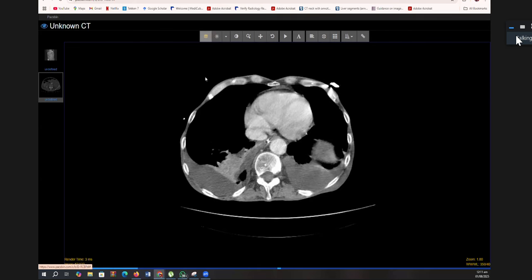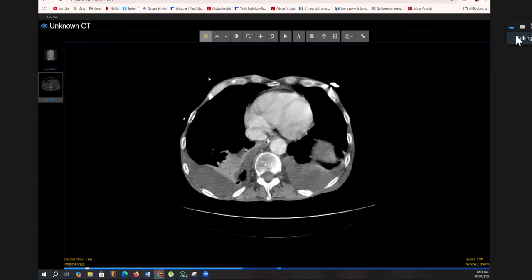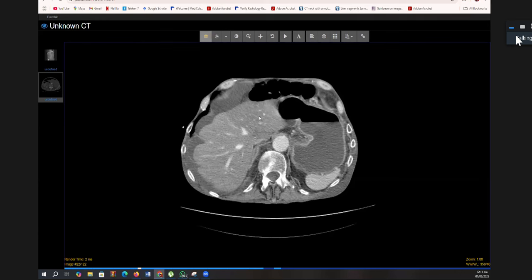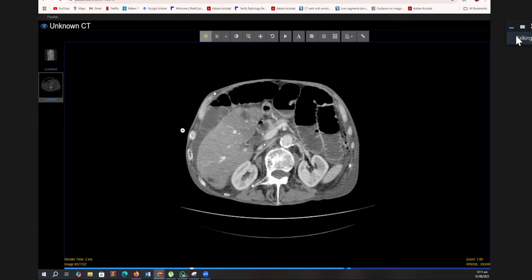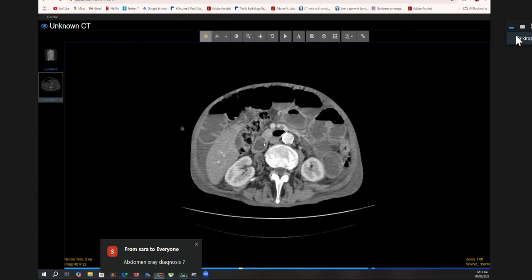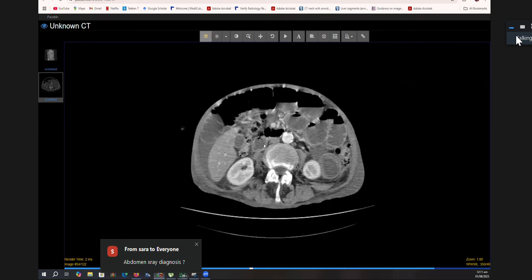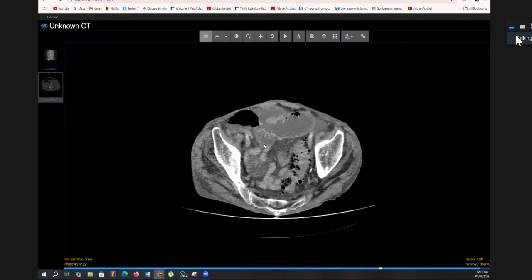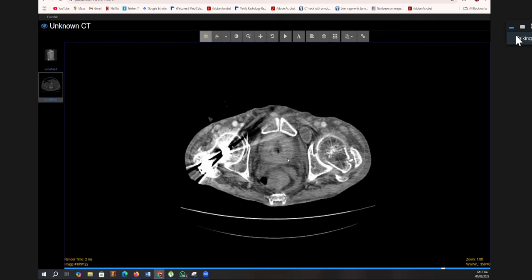Again, there is ascites, small bowel dilatation, and an NG tube with its tip in the normal position. While scrolling, I would take a look at the portal vein and the mesenteric vessels. Now, you said there's ascites. There is a small amount of ascites, and there are bilateral pleural effusions. So I will scroll till the last things. Now, just stop there. Go a little bit higher. Stop there.